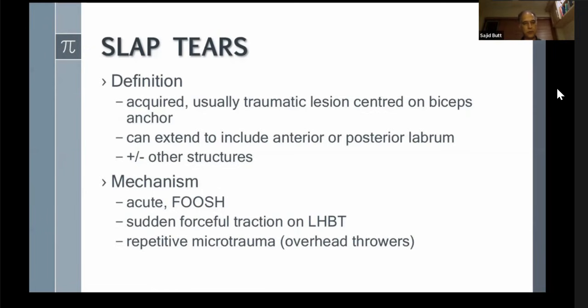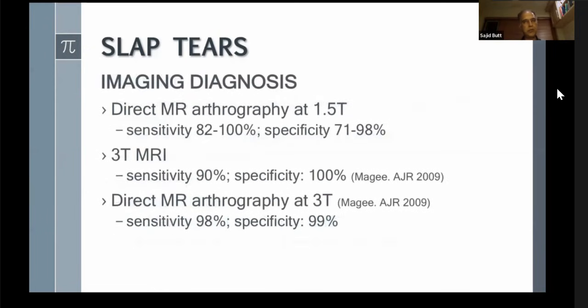And that is what a slap tear is. Usually, these patients have got a good clinical history, and the surgeons would write ?slap tear. And if that patient comes, please do an MR arthrogram. You would have a better sensitivity and specificity. If you've got good quality 3T MRs, you can get reasonably good studies, and we are getting better at that. But if you're starting off, I would suggest that you try and develop your eye and your concept by assessing the arthrogram images. They are so much easier.